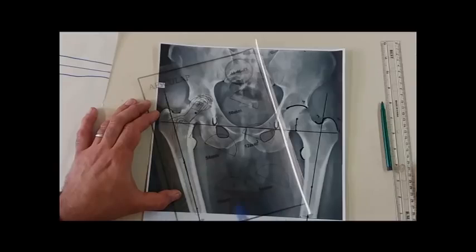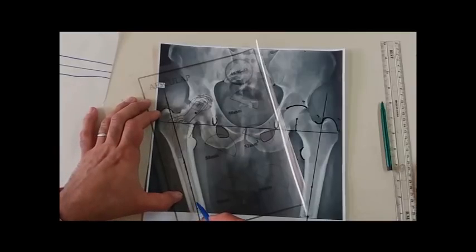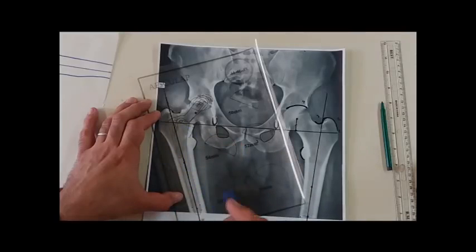Optimal fitness means what? 1 millimeter around the stem, still cancellous bone. I shouldn't trim the whole cancellous bone here, because stem to cortex contact is not allowed. I should keep some cancellous bone around the stem in both cemented as well as cementless. So around 1 millimeter of cancellous bone is still visualized all over the stem, and in the metaphysis maybe 2 millimeter. This is the maximum acceptable cancellous bone to be left around the stem.